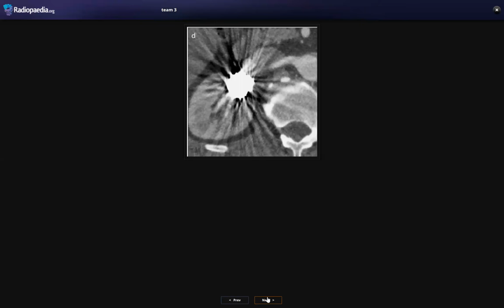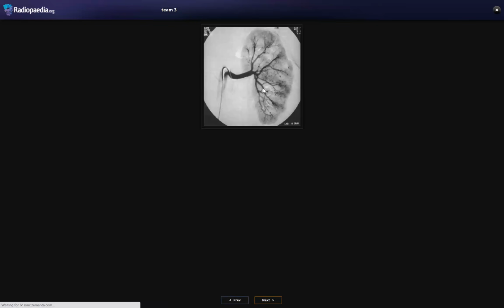No, I couldn't get it. So this complementary image. Can you describe? Okay, so this is the, can we enlarge this image? Sorry, because I put it as a slide. Oh, that's fine. I will try. Sorry for that. It's okay.